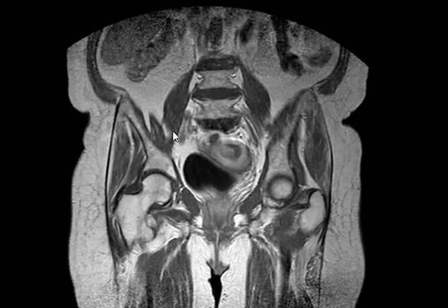There is no lymphadenopathy. There is no metastasis. The bladder looks good. The fatty tissue surrounding the uterus looks good. So basically, diffusion will give you nothing here. However, you can do it. It's just a sequence that will take 2 minutes.